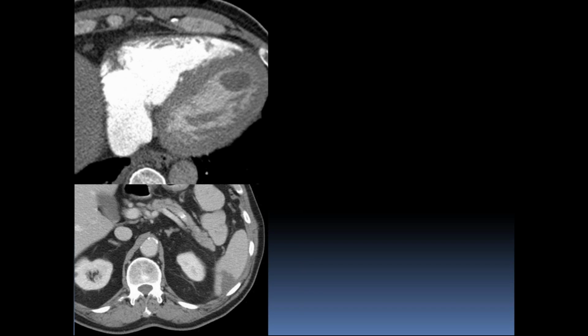You know that it's not a myxoma because it has nothing to do with being in the atrium along the septum. You know that it's not a rhabdomyoma or sarcoma, because it's not in the wall. You can see contrast completely around it, showing you the location within the chamber. So you've gone through the pattern and the location.